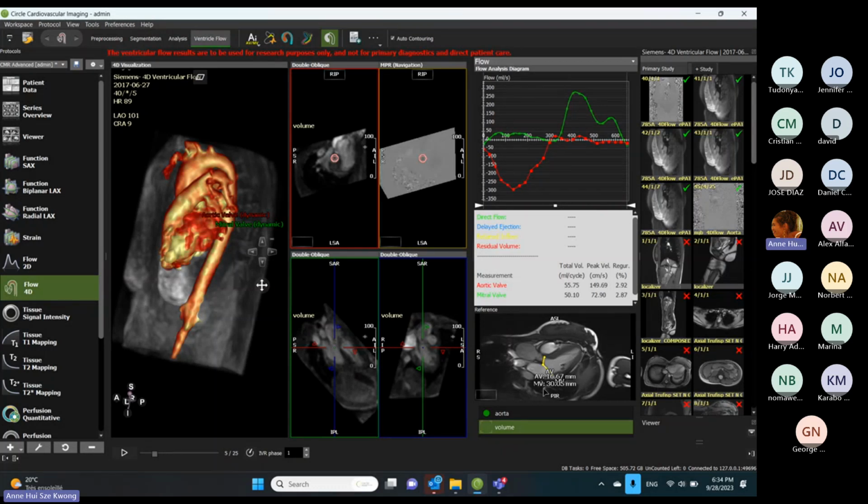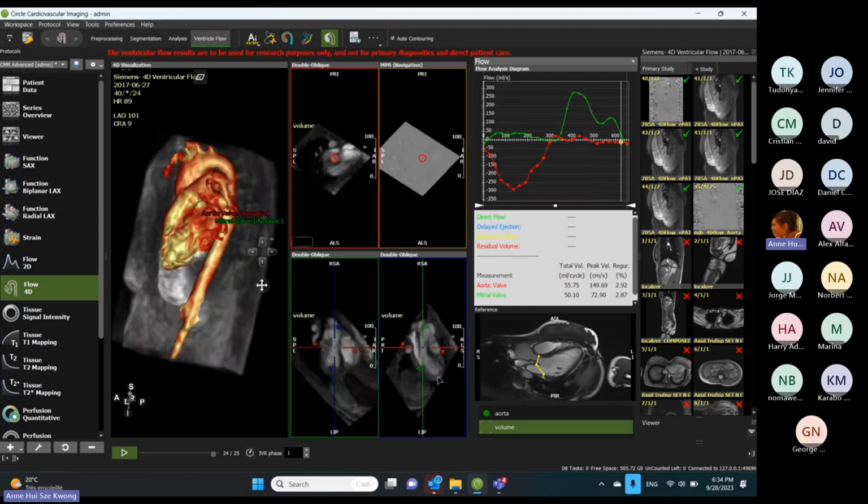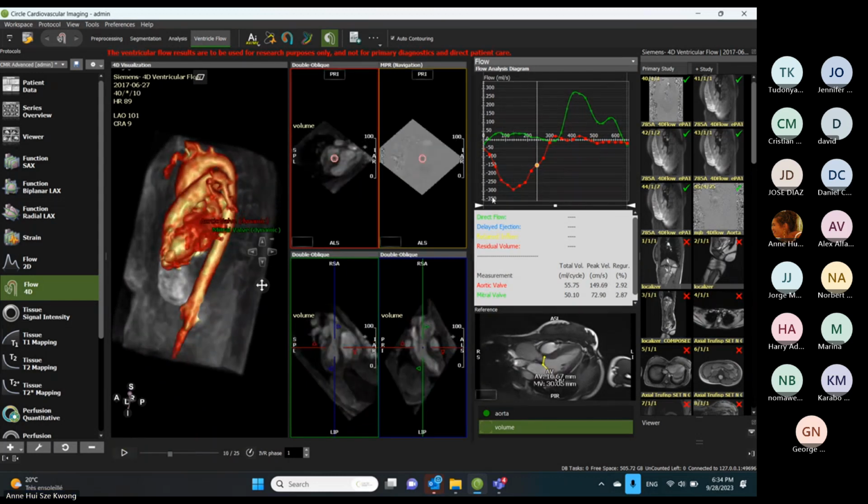For the intracardiac, you need a 3-chamber view cine if you want to go over artificial intelligence tracking of the valves. So you click on the AI, you will have the definition of aortic and mitral valve. Then you click on tracking on the valve in order to have the superposition between the 4D and the cine. And as soon as you do that, you will see your curves, aortic and mitral valve curves and results.